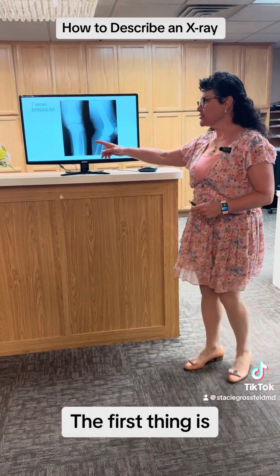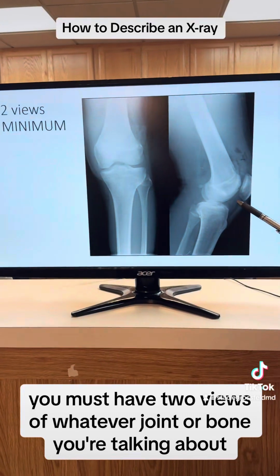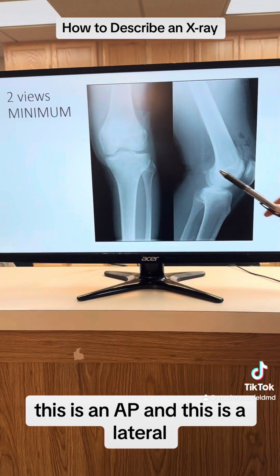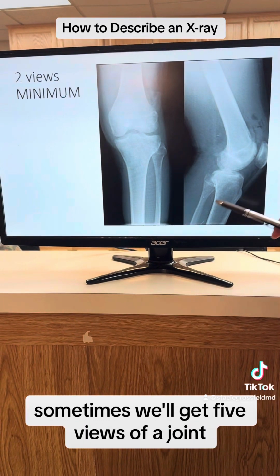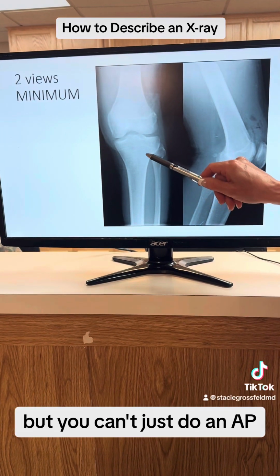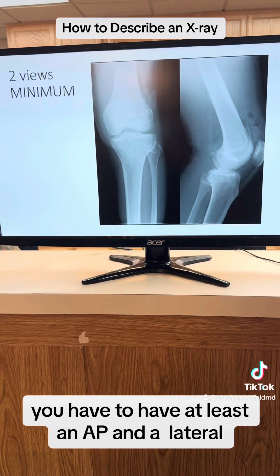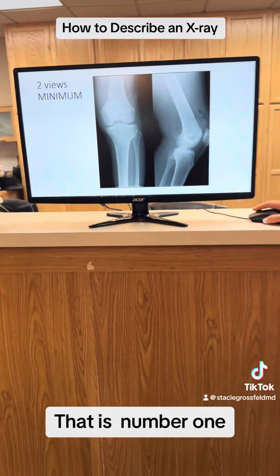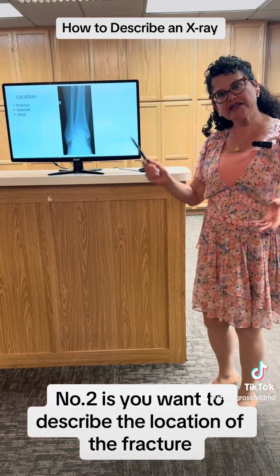The first thing is you must have two views of whatever joint or bone you're talking about. This is an AP and this is a lateral. That is the absolute minimum. Sometimes we get 3 views, sometimes we'll get 5 views of a joint, but you can't just do an AP, you can't just do a lateral. You have to have at least an AP and a lateral. So that's number one.